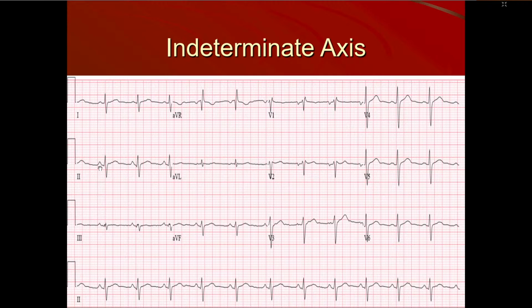So P looks a little broad to me out here. It is more than 3 small squares maybe. Now P is broad, so the distal end of the P wave is formed by the left atrium, and that is broadening the P wave in lead 2. Now I will look in AVF. In V1 you see the P wave is biphasic.